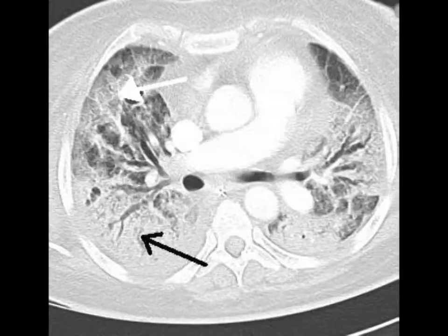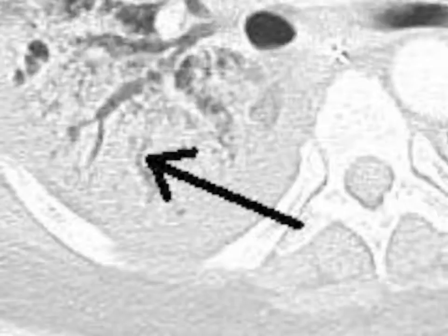Interstitial pathologies cause a nebulous greying of the lung tissue. Often this resembles the appearance of ground glass. This CT scan demonstrates the difference between these appearances. The white arrow demonstrates ground glass opacity, and the vasculature can be clearly identified coursing through the lung tissue. The black arrow demonstrates the very densely opacified appearance of alveolar shadowing.